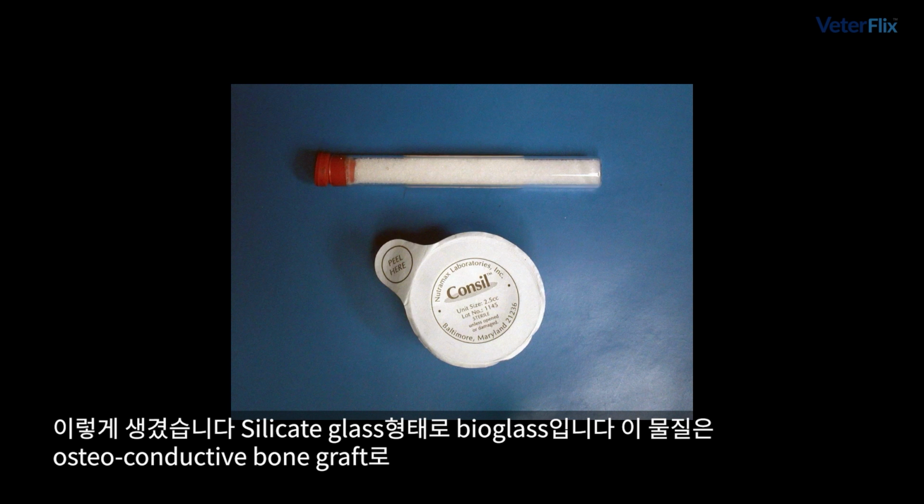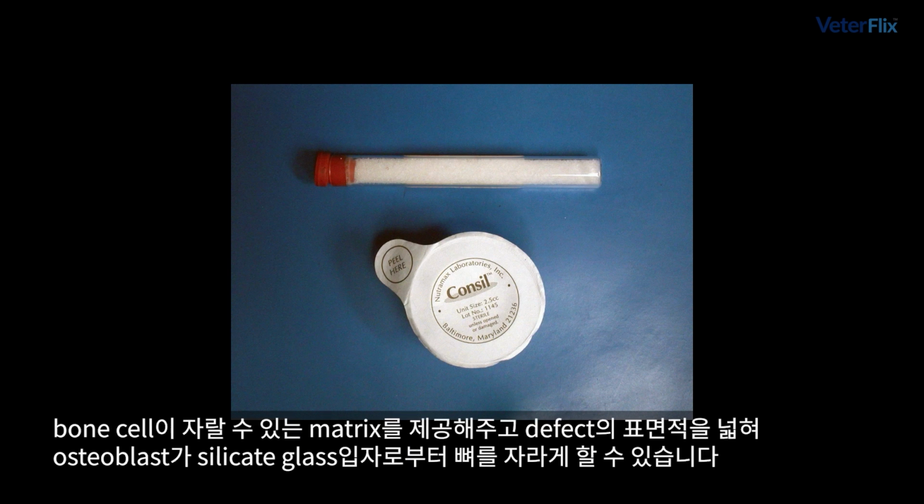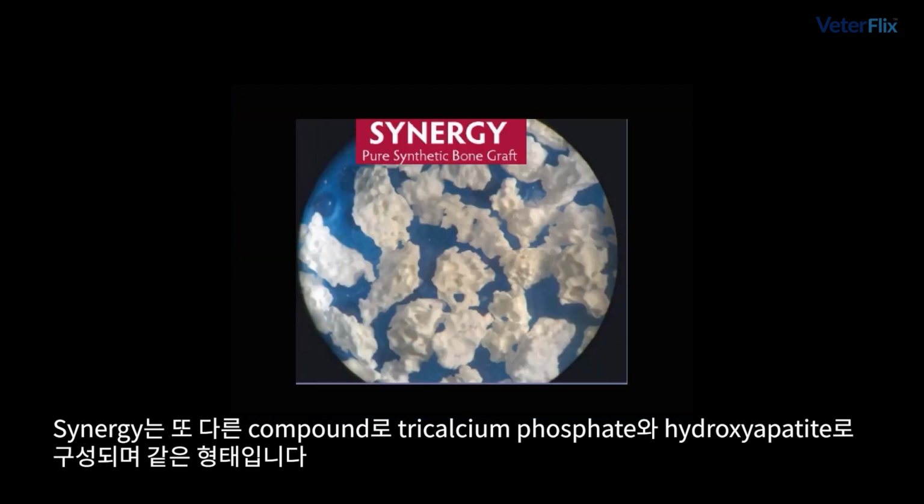It's actually a silicate glass. It's a bioglass that's an osteoconductive bone graft, which means it provides a matrix for bone cells to populate and increases the surface area in the defect so that the osteoblasts can start to reside on those little glass particles and grow new bone. Synergy is another compound. This is tricalcium phosphate and hydroxyapatite, and it works quite the same way.